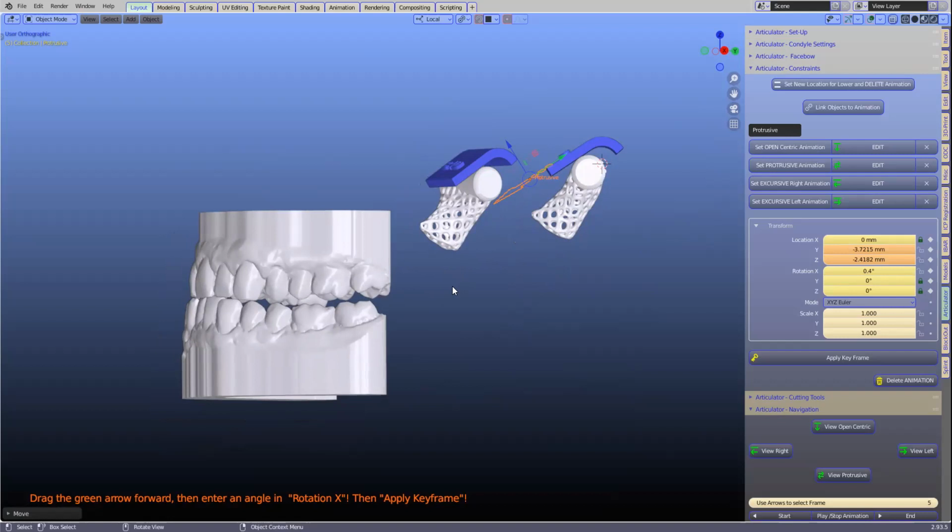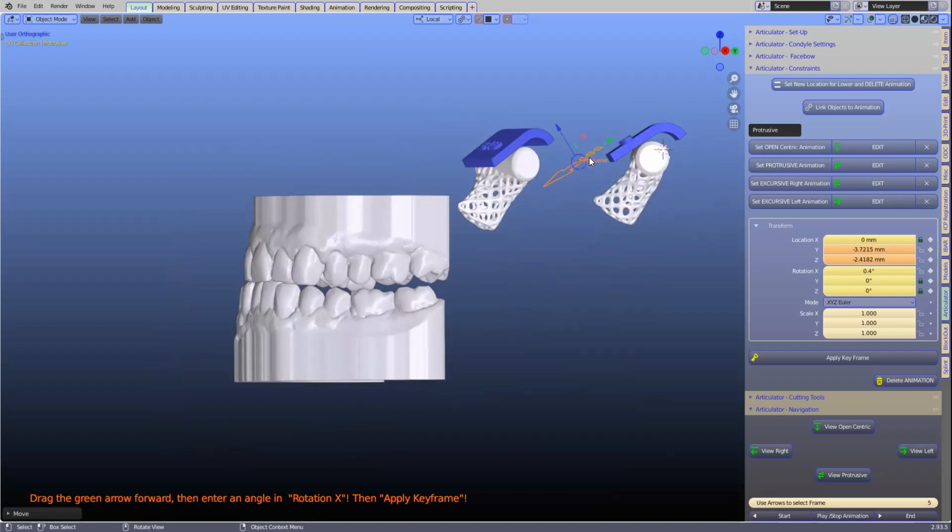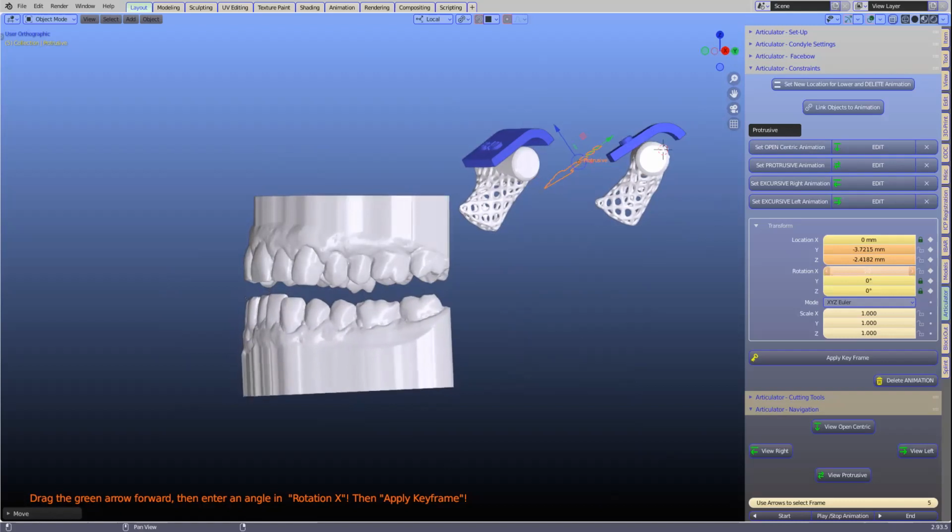Michael, sorry, when you said we don't need an articulator, can you just explain that? I mean, you're really talking about a buccal scan here and then aligning that with the ICP alignments module. No, we wouldn't have to align it, because if you're taking a buccal scan, the two models are already in the correct occlusion. That's correct. Okay. So in this case, we've moved that forward and we're going to open this up.